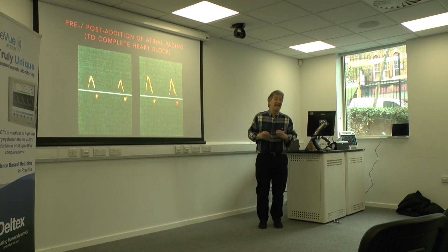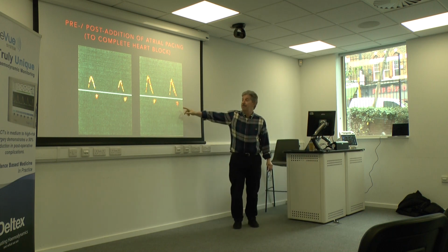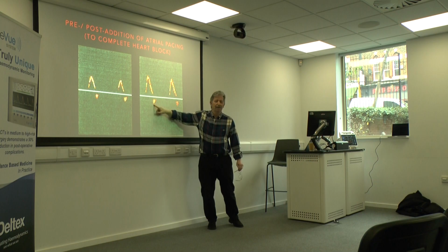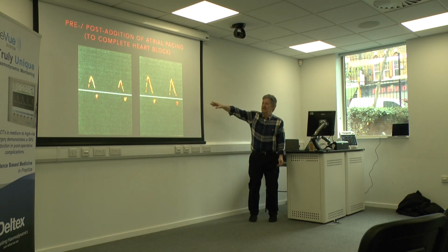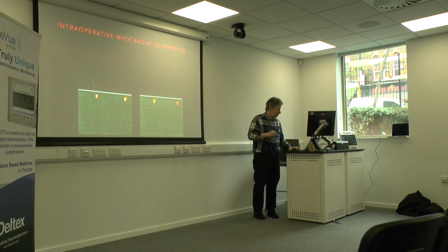Atrial pacing. So again, in patients with a poor heart, often the atrial kick can make a big difference. And this is before and after switching on atrial pacing. And we can see it sort of doubles the flow output. Remember I was talking about a little bit of reverse flow being normal? So that's okay, but you can see, again, I'm not going to give you any numbers, just see it's doubled, just doing that atrial kick 15 seconds apart.